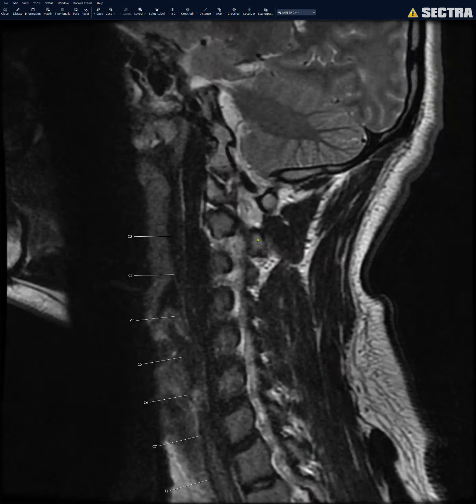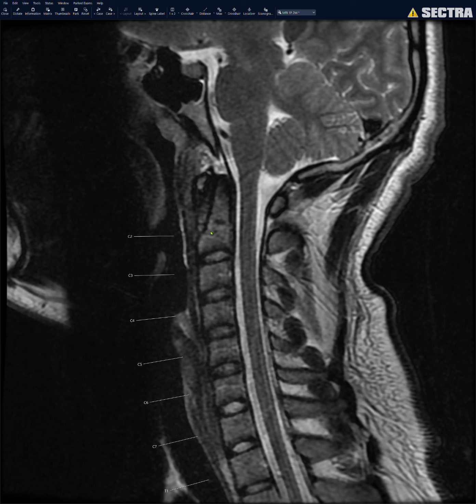And after that, I look at the alignment and the vertebral body heights. So make sure that there's no subluxation. Look at the anterior spinal line, posterior spinal line, okay, spinal laminar line. Make sure everything's nice and aligned. I look at the vertebral body heights, make sure they're all intact. I look at the disc heights, and I comment whether or not there's any disc height loss. Okay. Look at the basion-dental interval, atlantodental interval. Make sure alignment is okay.